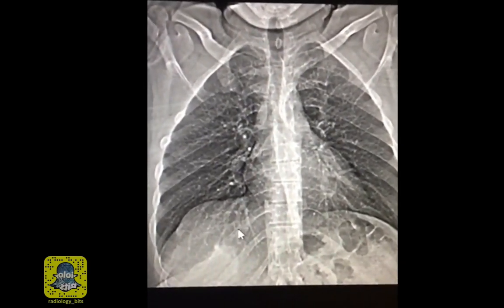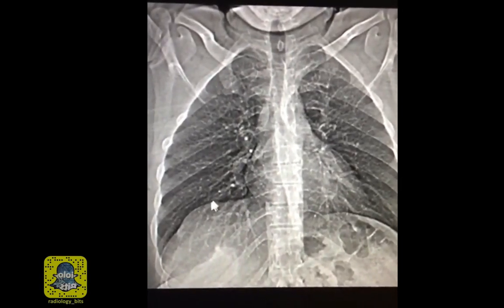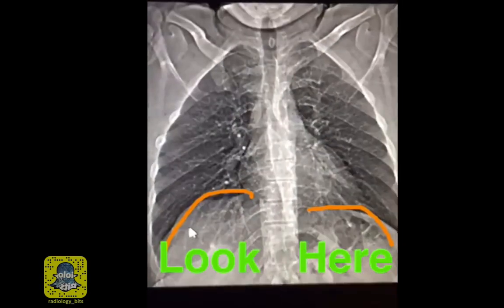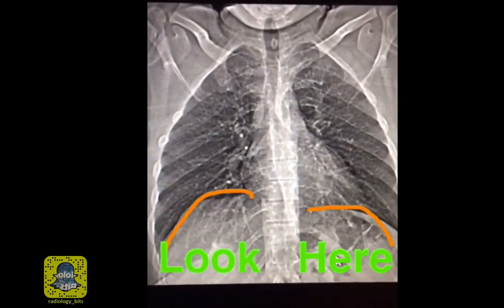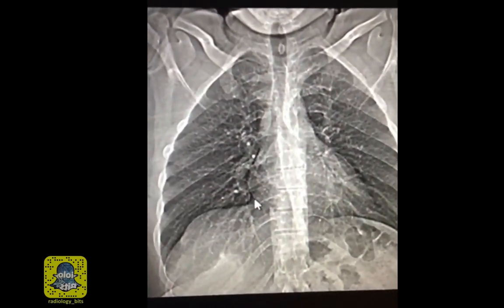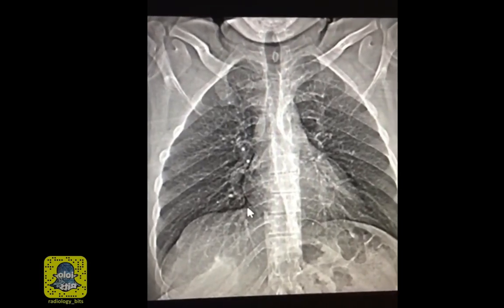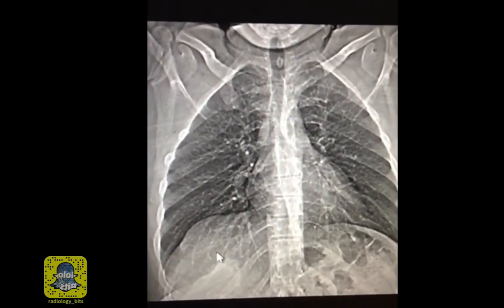And this is an extremely important teaching point. When you're looking at a chest X-ray, don't stop here. Look below the hemidiaphragmatic edge for abdominal and for lung abnormalities as well. In other terms, on a chest radiograph, what's below the diaphragm is not only abdomen.